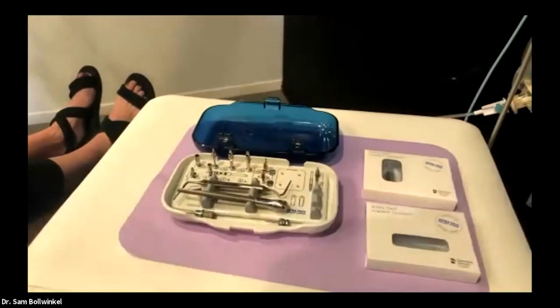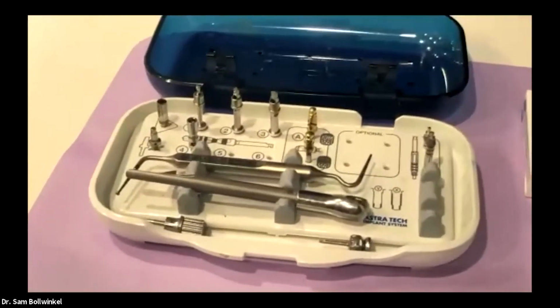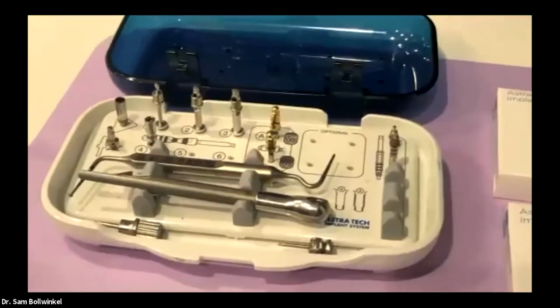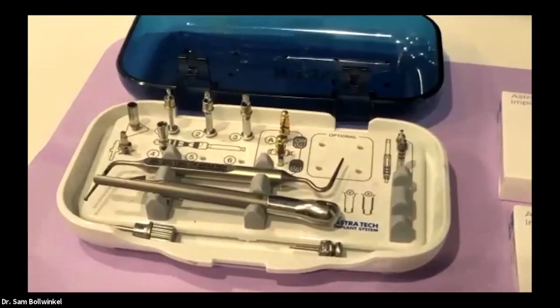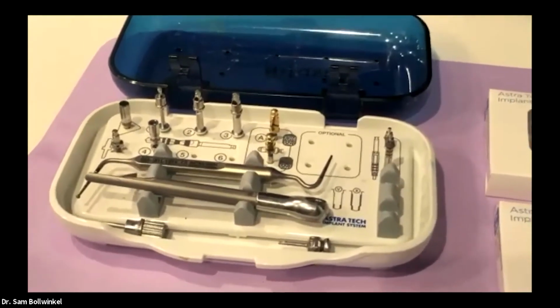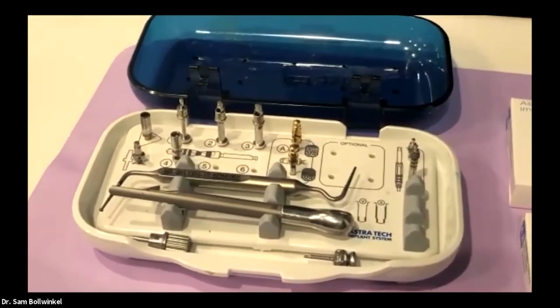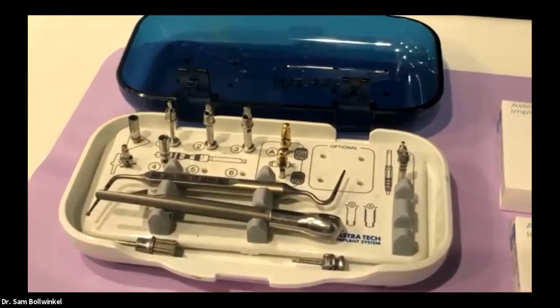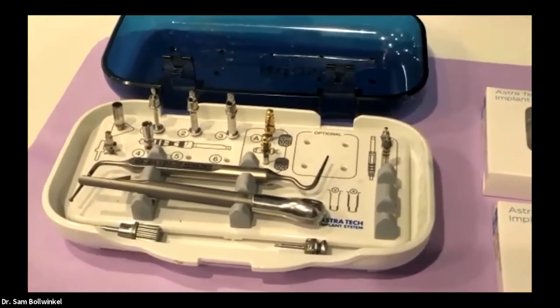Because we've gone through and done a restorative driven implant, this is literally all that comes to our surgery. Those of you that are doing implants, have exposure to implants, you realize that typically you've got an instrumentarium or armamentarium of 100 or 200 pieces of instruments, so that when you flap, you have everything right there at your fingertips that you need to provide that implant service for your patient.